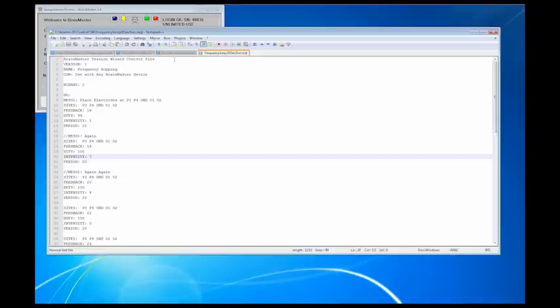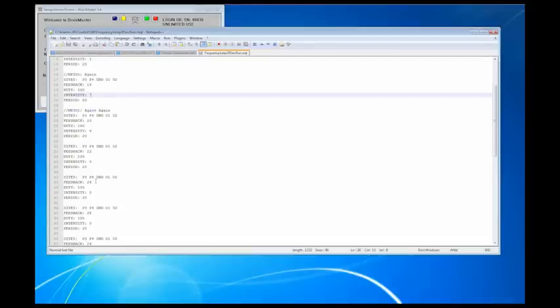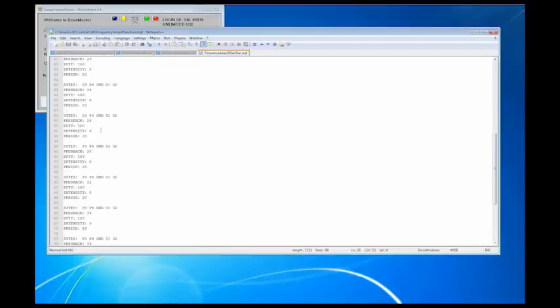Then they're going to go to 20 and 24 hertz, 22 and 26, 24 and 28, 26 and 30, and so on throughout this entire thing until we're down here where we're going back to 16 and 20 and 15 and 19.